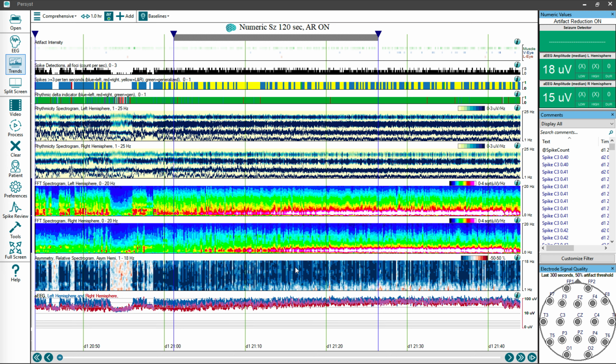And those are adjustable in the FFT parameters. But to understand what it's exporting, it's going to do the microvolts, the square root value of each microvolt value, and put it into the spreadsheet. And that's why if I go and I change the units that are used to microvolts, then that spreadsheet will have microvolt values. But again, it'll still be in half hertz per column. And each row will be the FFT epoch length, and so you get 40 columns for each trend.